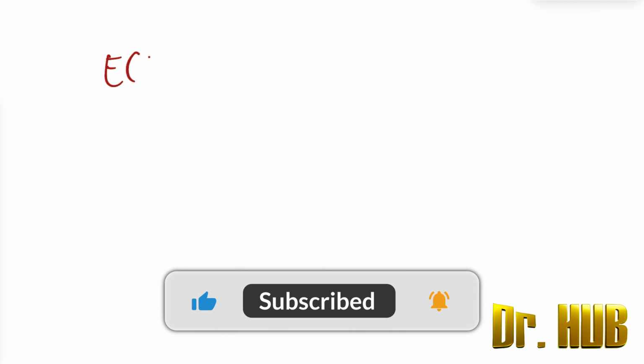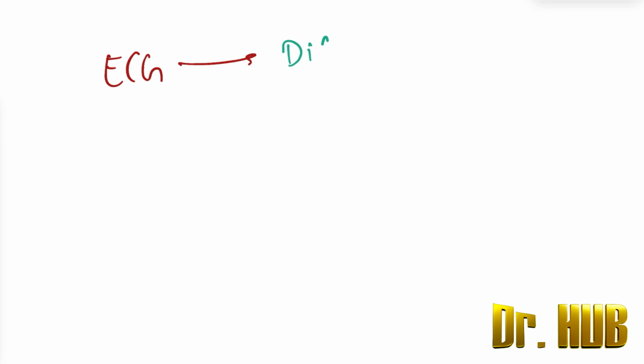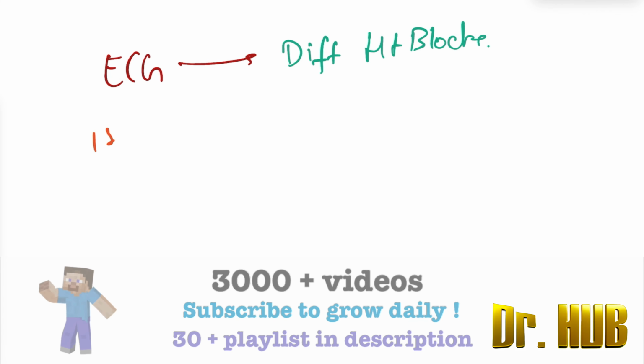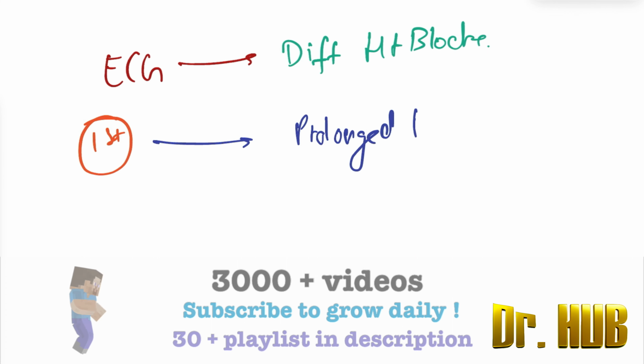Going to focus on the ECG, and this will be the changes with respect to different heart blocks. So let's start. Firstly, we are going to see the first degree heart block. In terms of the first degree heart block, what does the ECG show? There is a prolonged PR interval.